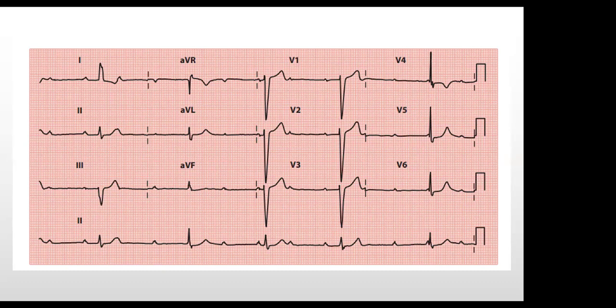Hello, good evening again. Go ahead. Yes, you can see there is AV dissociation. And looking at the QRS complex, it is wide this time, looks broad. So this is complete AV block with ventricular escape rhythm. So this is complete heart block, you mean? Yes, complete heart block.